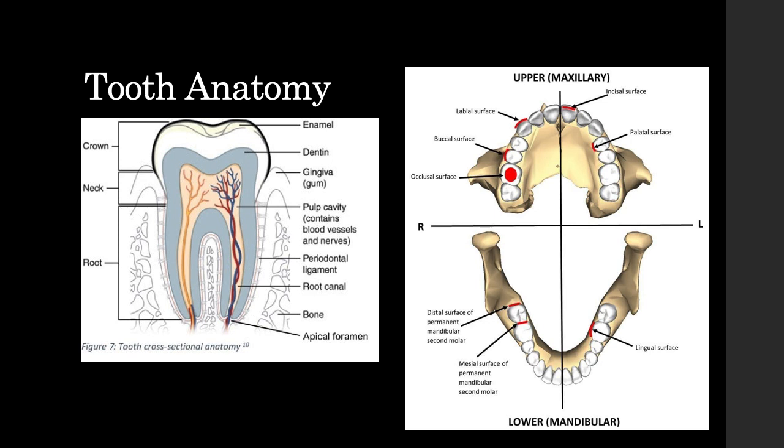The enamel is made of hydroxyapatite, which is the same thing that bone is made of, which is why it looks like bone on CT and X-ray, and why it's so useful to use these techniques to image teeth. The dentin below is quite soft, and it has a neurovascular supply. It doesn't have a neurovascular bundle within it, but it has neurovascular supply. Because it's soft, it's able to deform and transmit pain signals if something irritates the enamel above. And then the pulp below the dentin contains all the neurovascular bundles. So they will detect changes in heat and pressure, and that's the thing that is quite sensitive if you've got sensitive teeth. That's also the reason why, if we have an ulcerated tooth, it bleeds and it hurts.